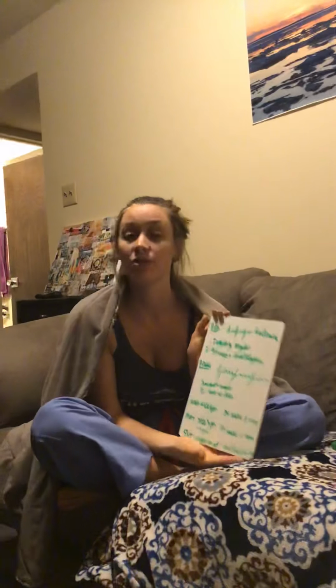So Veronica covered the first 3 out of 7 atrial dysrhythmias that exist, so I'm going to cover the last 4. So one that we're going to talk about is AFib. This is pretty common. AFib is definitely not uncommon. So the most important thing with AFib is that it is an irregularly irregular rhythm. So what this means, the first irregular is that it's not predictable, and the second irregular means that it is not equidistant. So not predictable, not equidistant rhythm.